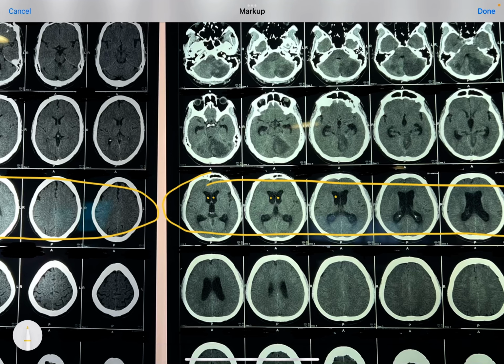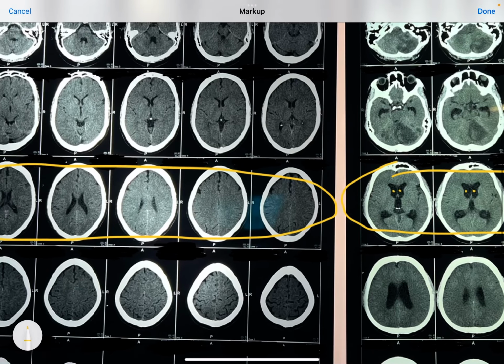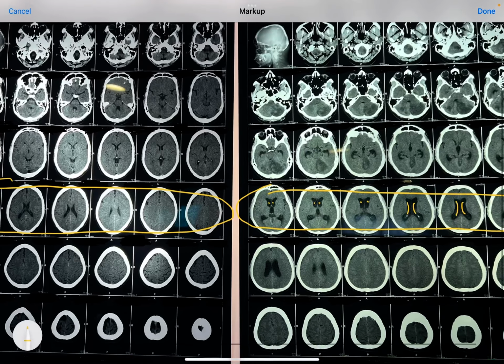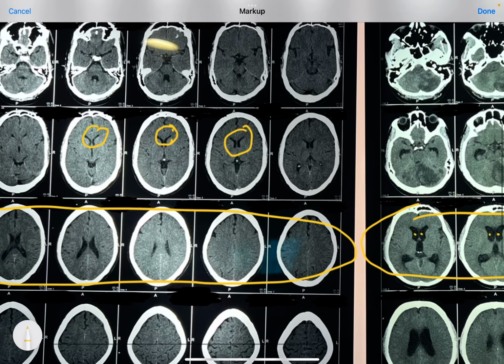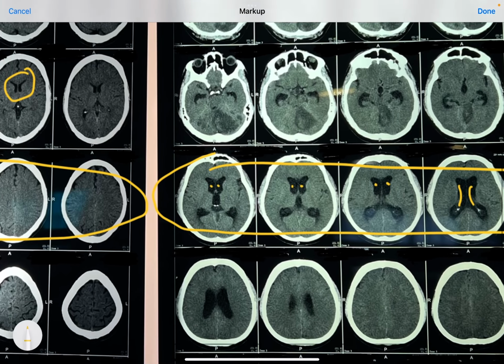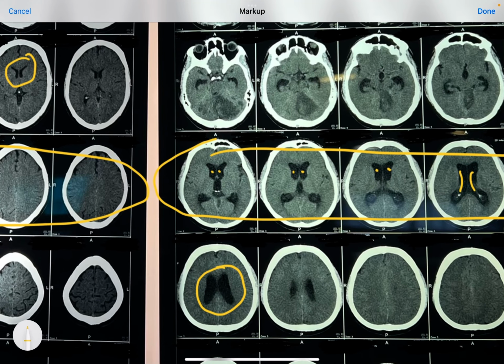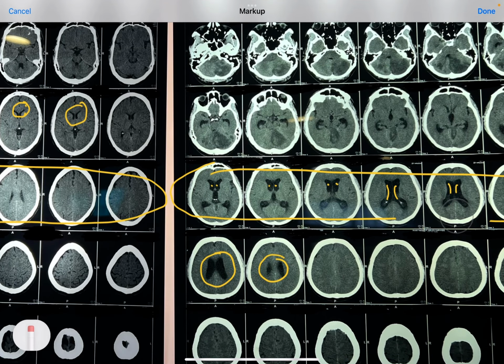These are the two lateral ventricles, where the CSF is produced and kept. These are much enlarged. Just compare these: these are the lateral ventricles, which are very small in caliber. But when we see this one, they are extremely enlarged. These are the two lateral ventricles. Lateral ventricles means first and second ventricles.